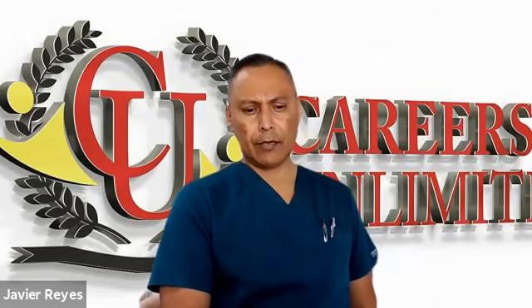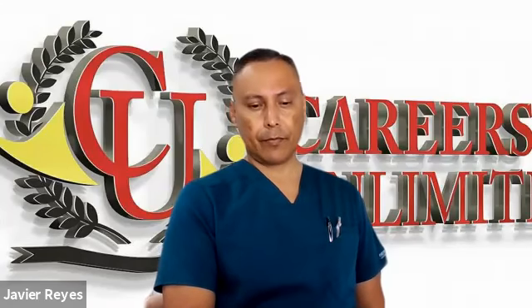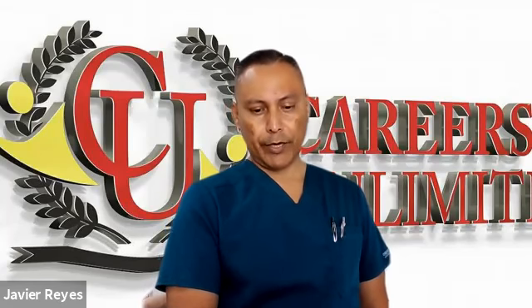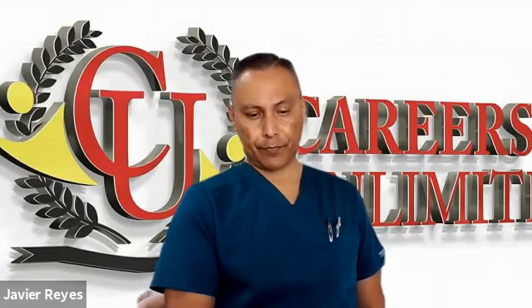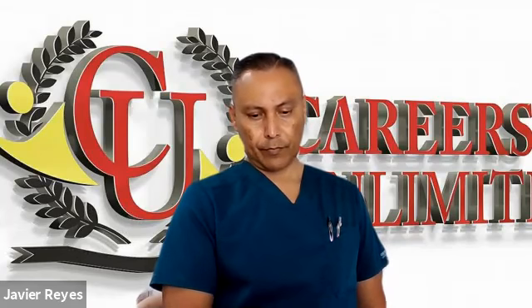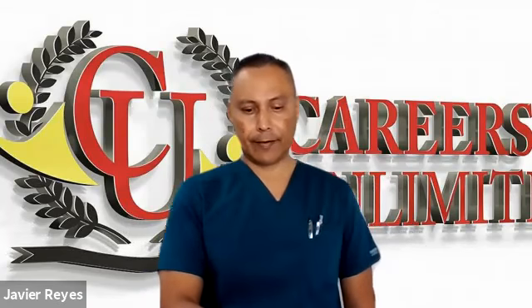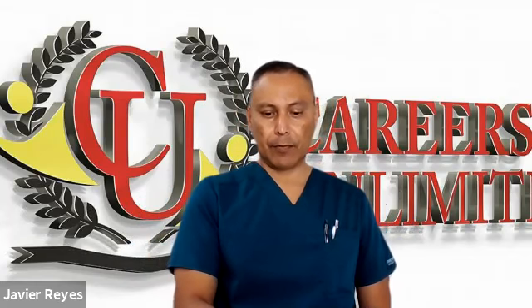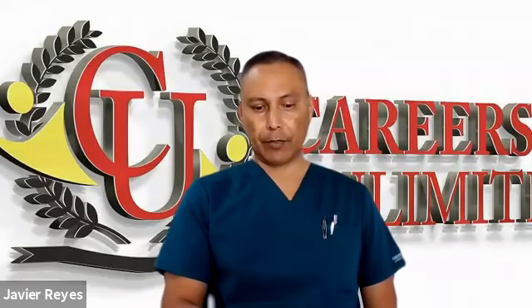Look at 19, same thing. Look at the P waves. It looks like it's inverted or biphasic. If you look at it closely, same thing. Look at the rate, the regularity. 20, the same. The P waves are abnormal. What's 21? Is it a right or is it a left? It's rabbit ears, right? It would be a right bundle branch block.